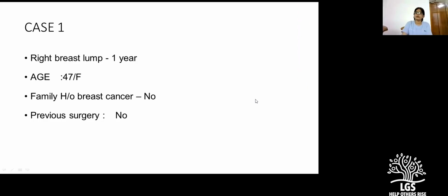So I thought I will go over the same with some cases which we managed in our practice. I've put up a lot of images here, which gives us an opportunity to revise our understanding of mammograms, and I've put up some correlating ultrasound images as well.